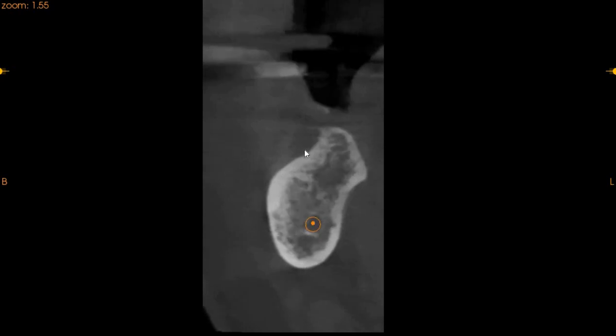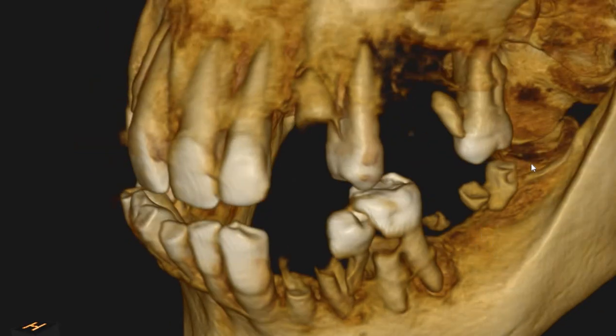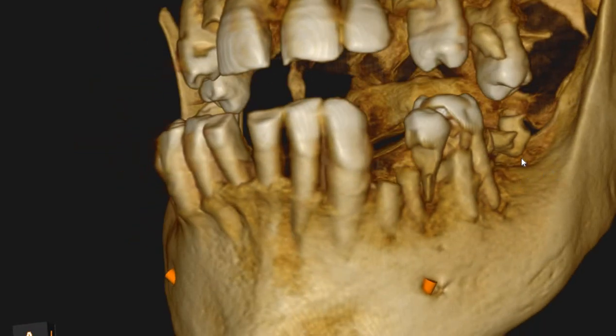The lower left second molar, this is the lower left second molar. We've got lingual fossa. At the same time, we've got approximately 5.5 to approximately 13 millimeters of bone present in the lower second molar, but this is a lingually inclined ridge with a little bit of thinning there. So the buccal side, we will have a defect here. This is this particular aspect, this aspect, right?